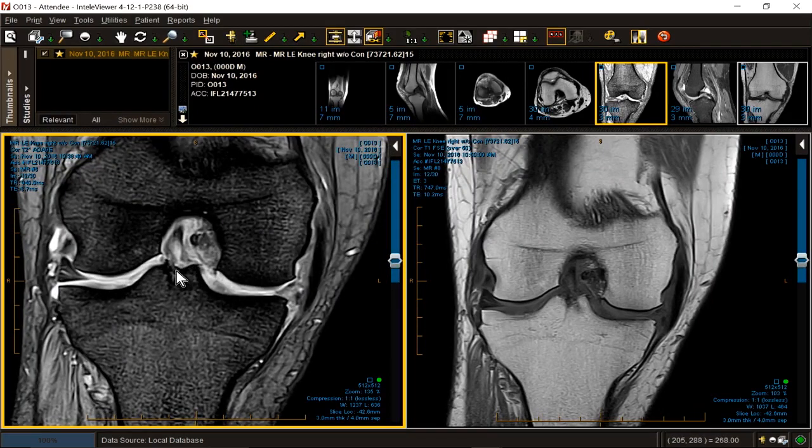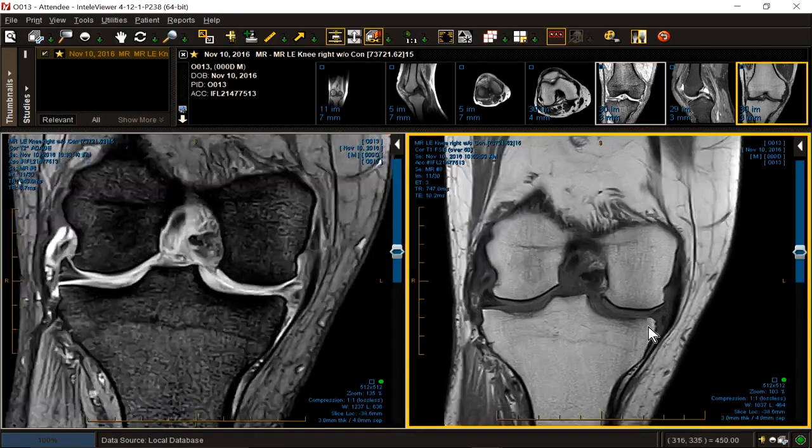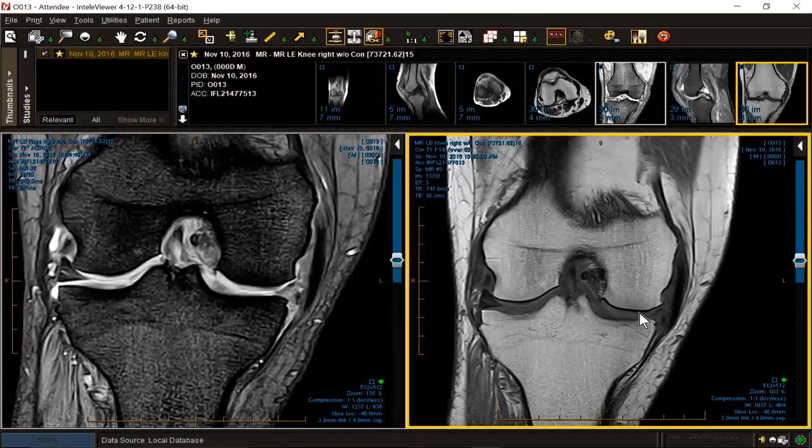We won't dwell on it right now. But they have extensive medial weight-bearing diffuse class 3 chondromalacia. Does it penetrate bone? Does it penetrate the subchondral plate or cortex? No. Is the medial compartment remodeled? Yes. It's not curved, it's flat. That's a problem.